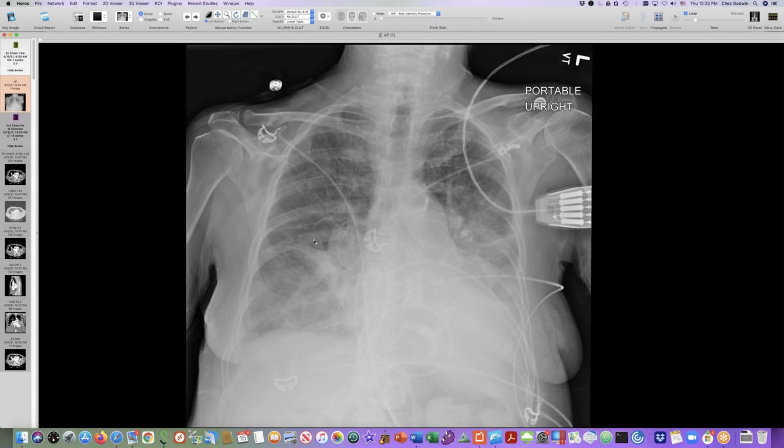Okay, so abnormal chest radiograph. It's interesting, this relatively smooth interface between the abnormal and normal lung there. It's bizarre, isn't it? It's respecting some kind of boundary, but it's clearly lung because you have airways passing into it. Yep. Absolutely. Very interesting. I don't get it.